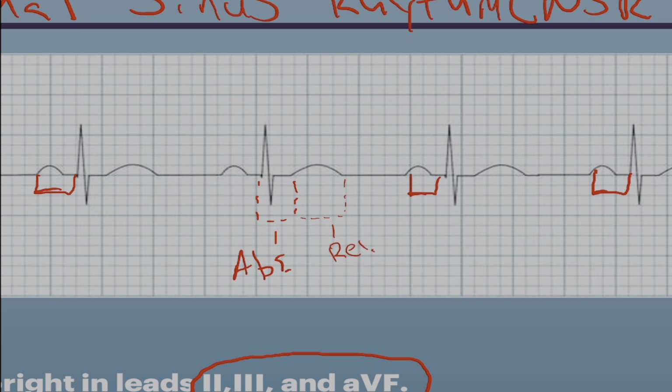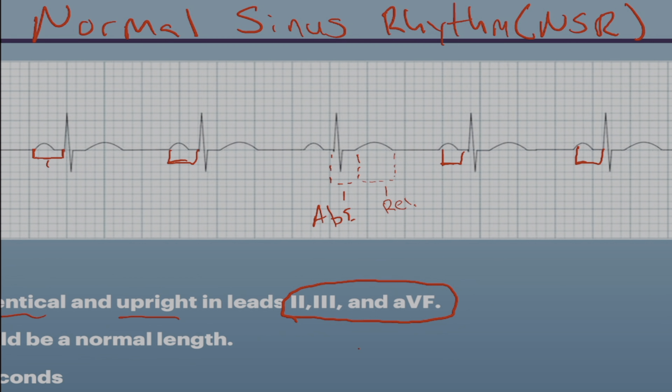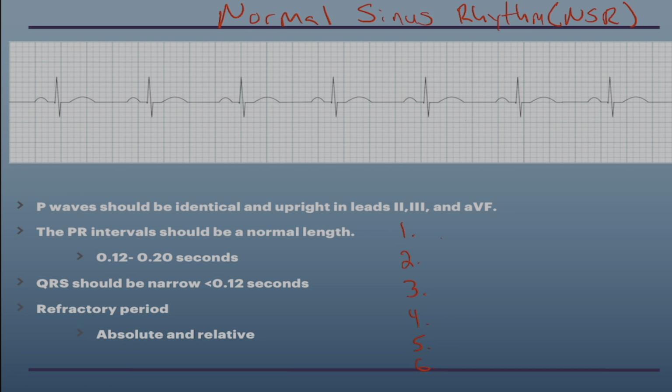So it didn't travel the normal path of electricity, and our EKG monitor sees that as a very odd looking wave of depolarization traveling through the heart, because it's actually traveling from direct cell to cell contact instead of going through the heart's nice smooth electrical conduction pathway. The first thing we're asking ourselves is, is it fast or is it slow?